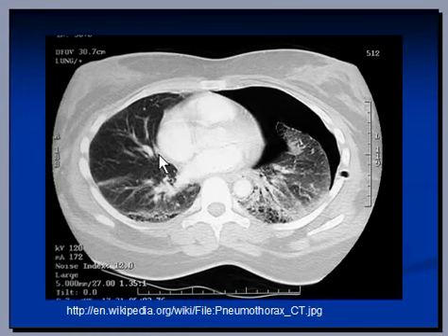On the right side, you can see vascular markings going through the lungs. On the left side, this is the collapsed lung here, and this area has got pneumothorax, no vascular markings. These are ribs, and you can also see a chest tube, a tube passing through the ribs going into the pleural cavity.